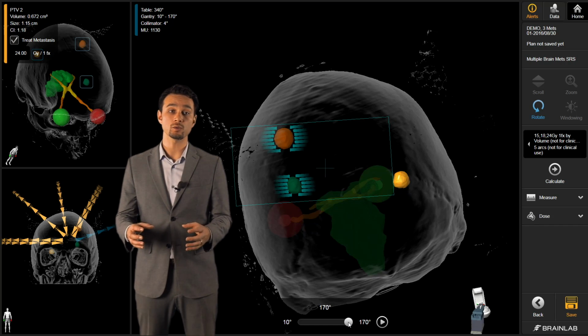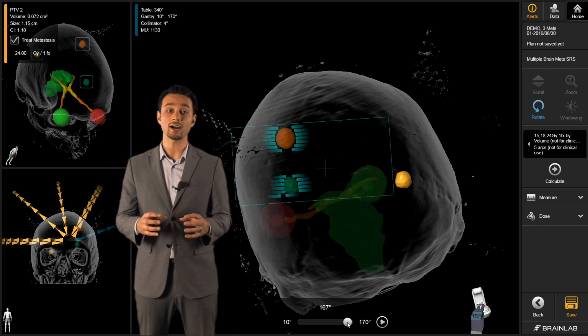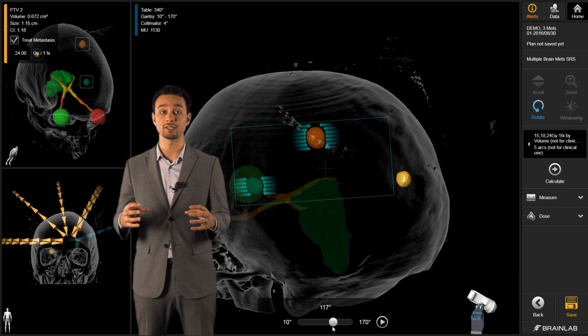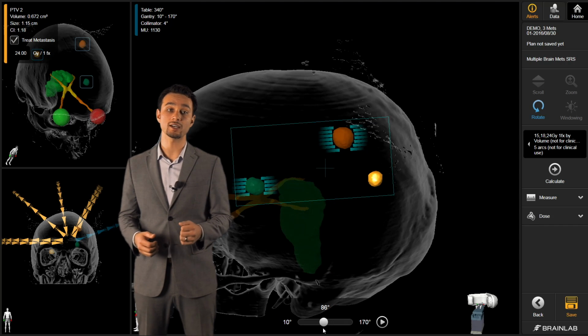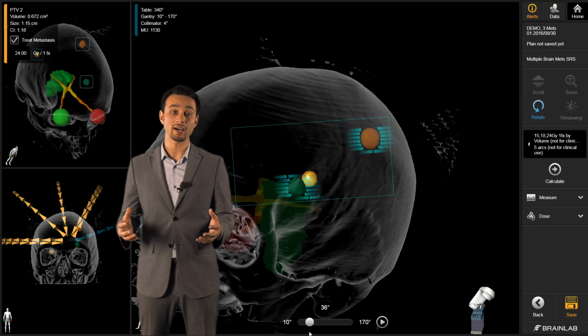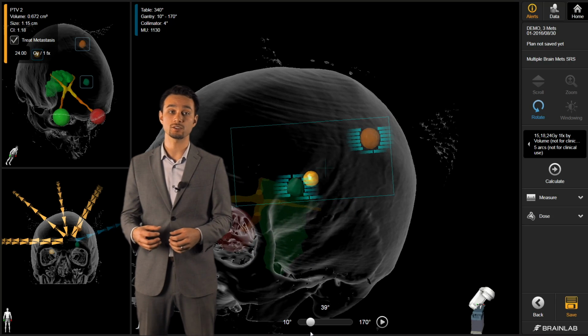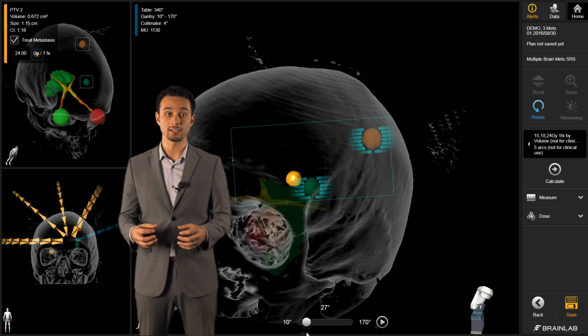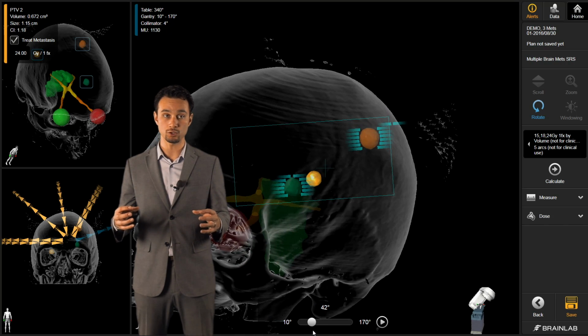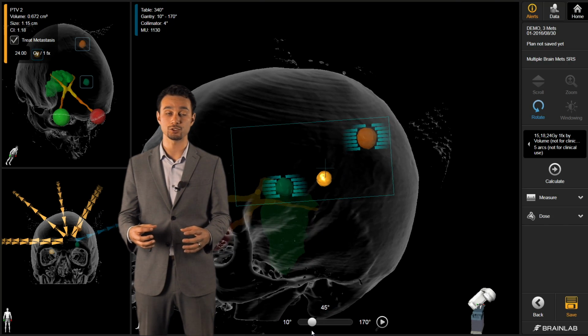And one technique when doing this is we never allow apertures to open up to cover 2 tumors that may line up in the MLC leaf direction. This can be visualized here with the green and the yellow met. Traditional VMAT techniques will treat all targets with all arcs. And in doing this, you're going to get a lot of this bridging dose in between these 2 tumors, irradiating all that normal tissue in between.